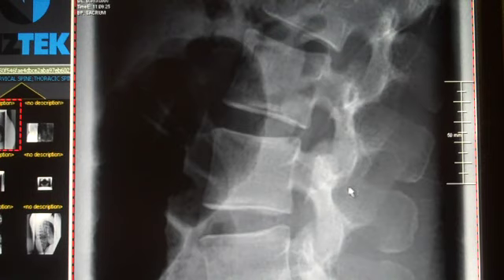Back here is the spinous process, all of this, and we see that they are very tall, they are huge, but also notice that density-wise they're very dark. And so although they're very dark and very large, we still are not going to see them very well on a lateral view. We see the inferior vertebral end plate, we see the superior vertebral end plate, we see the intervertebral disc space. Now this dark area out here is just a gas pattern in the large intestine, and we do see some gas patterns up in this area right here.